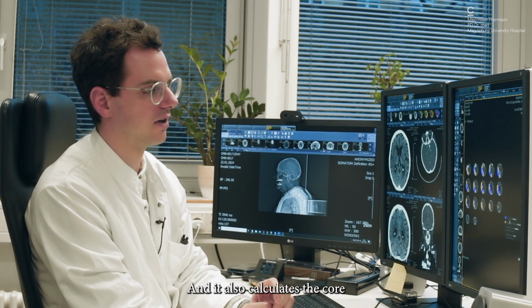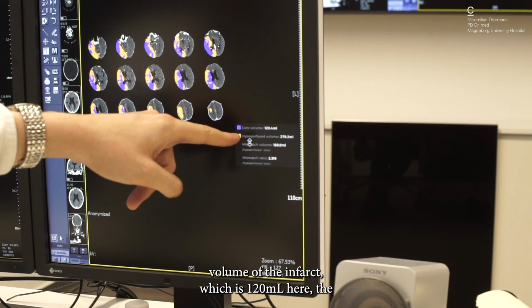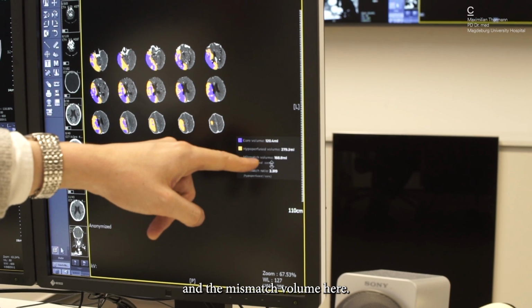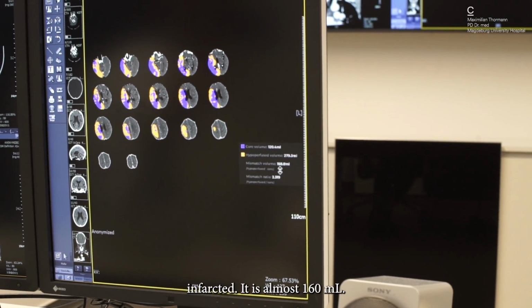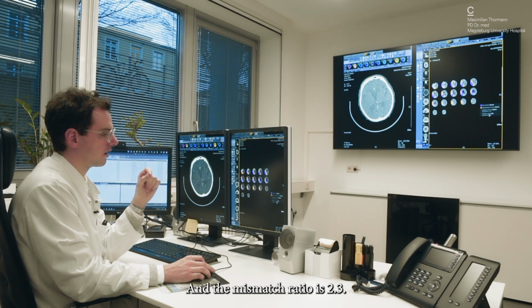And it also calculates the core volume of the infarct, which is 120 milliliters here. The hypoperfused volume is 279. And the mismatch volume here, so the parenchyma that is not yet infarcted, is almost 160 milliliters. And the mismatch ratio is 2.3.